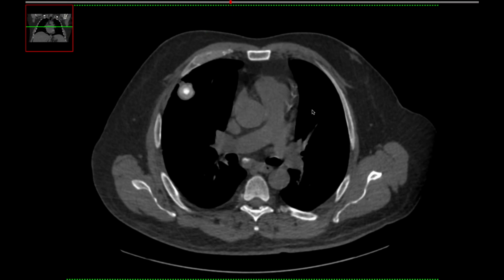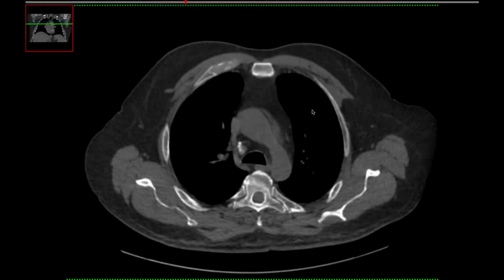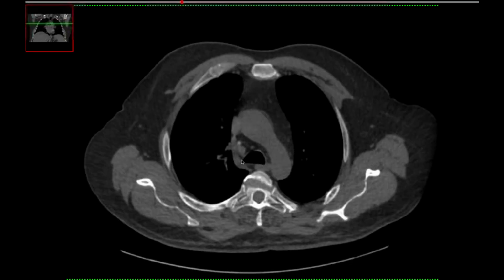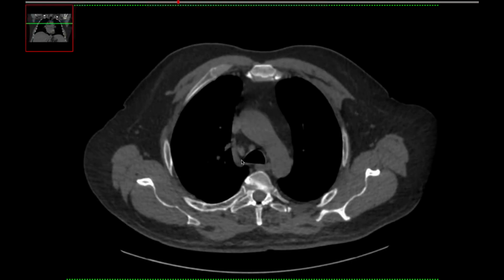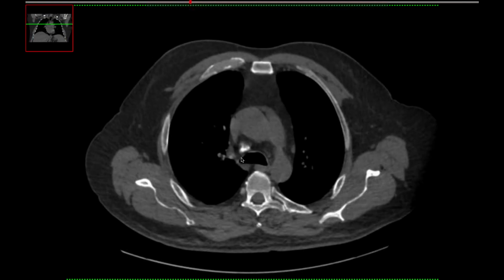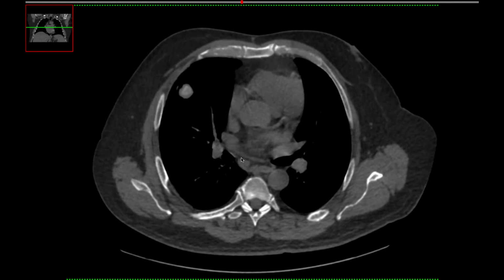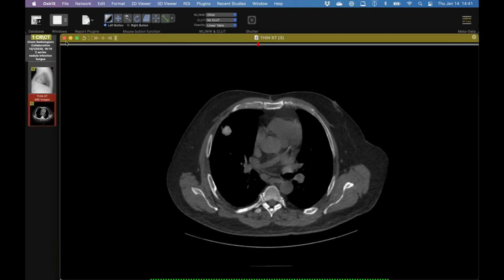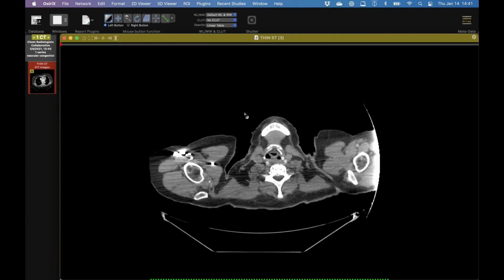One other consideration for this pattern of central calcification is dirofilaria. Isn't that like dog heartworms? Yeah, it's the dog heartworm. And it looks just like that. Very clean nodules. They're typically in the bases because it's blood-borne, so it goes in an embolic distribution down to the bases. Very smooth nodules with a nice central calcification like that. So that would be a consideration. Now, I don't know about mediastinal lymph nodes in that equation. I think that's better for histo.